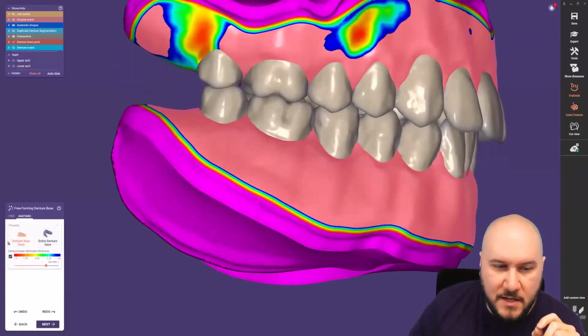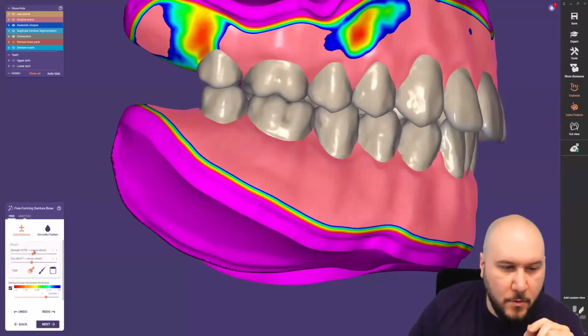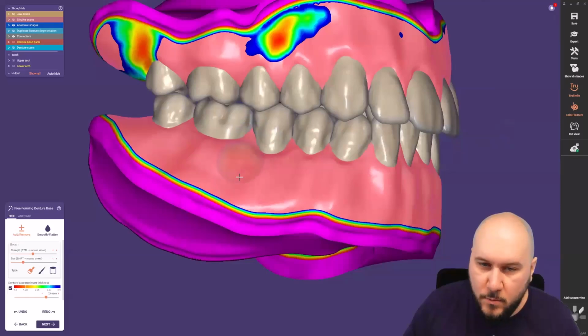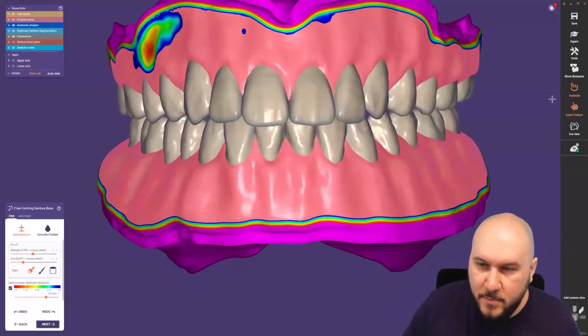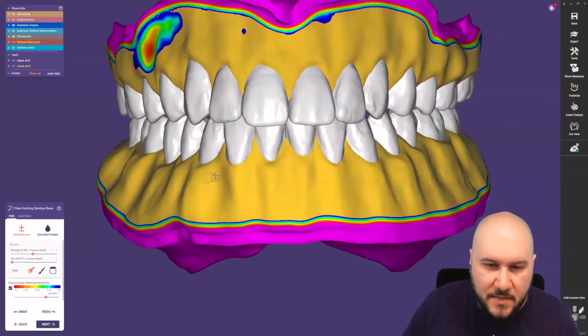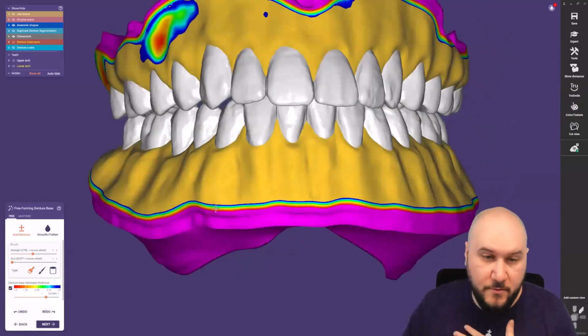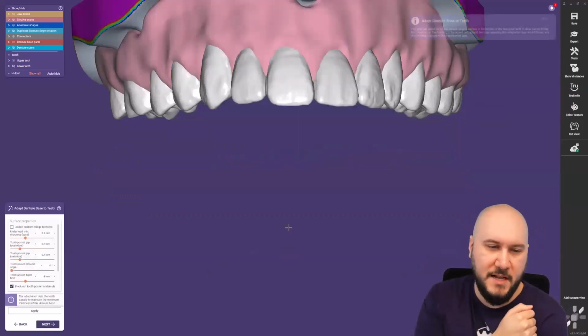If we, for example, want to use that one a little bit higher, set that down or whatever, or we want to give them a little bit more support, or make the alveoles a little bit more visible. I think there are more things to come when you want to have, for example, a free-forming here. Feel free to work with that. Free-forming is, from my perspective, the best thing when you want to work and have an individual style for this prosthetic part.